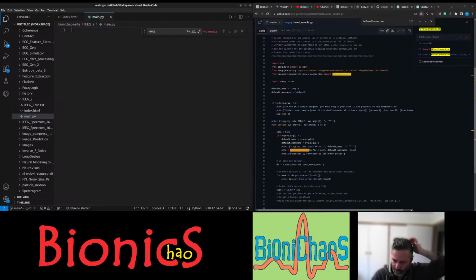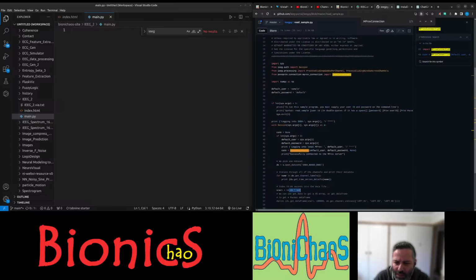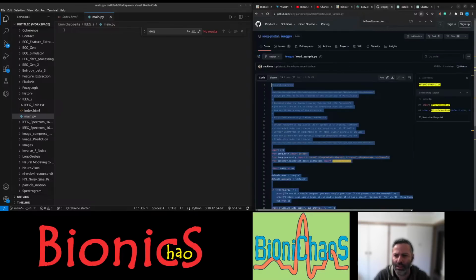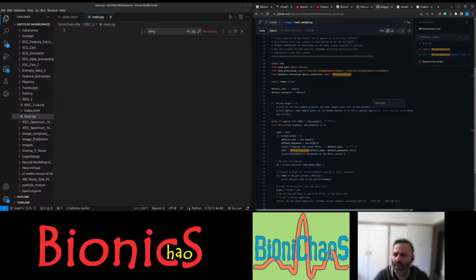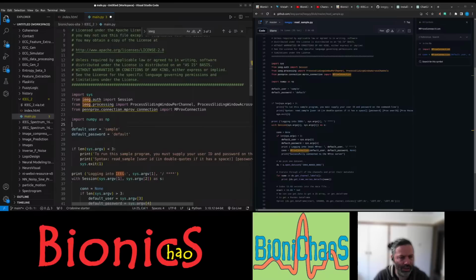Read sample. I want to read sample and also store it. Printing a shape. Doing some sort of scaling, is it? No. That's the start time. I was wondering if this was tested with one of the datasets, like how to make sure it's actually working with all the datasets. University of Pennsylvania. Read sample. Okay, let's rename this. Just in case.